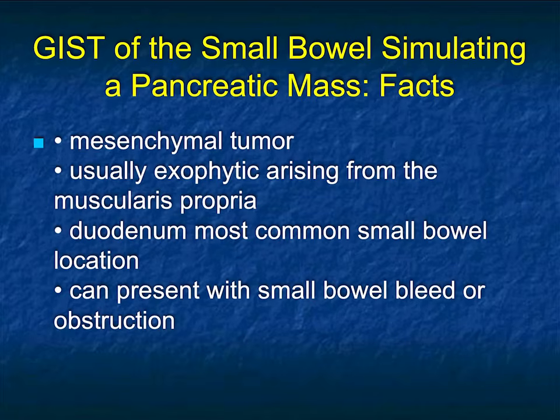Now, GIST tumors. We mentioned tumors of the duodenum before, like a duodenal adenocarcinoma or a met from melanoma. But GISTs and carcinoids commonly occur and are vascular in the region of the duodenum. It can be very tricky.